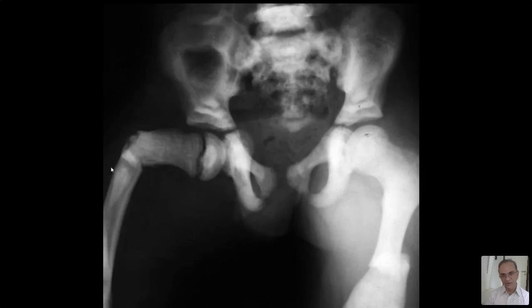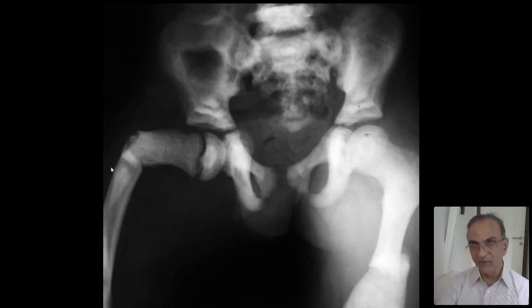Now this is so interesting here. Look at the left femur upper third. The bone looks so dense and still there's a banana fracture. Now these are brittle bones. So these patients can fracture. So add to the woes of all of these, they have anemia, osteopetrosis. They have abnormal things going on in the skull, and they can have fractures easily. And the thing is that these fractures don't heal. So that's a big deal. I mean, the human burden of osteopetrosis is phenomenal. Forget that it runs in family, right?